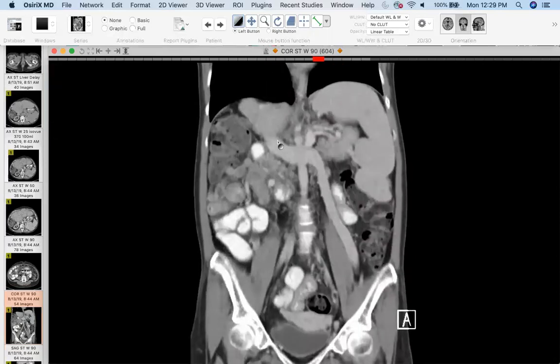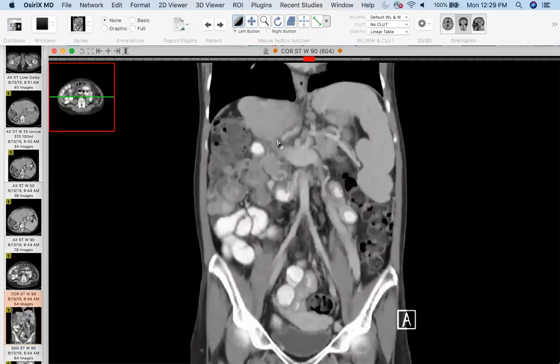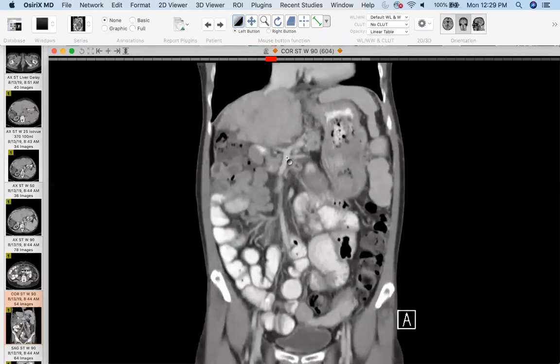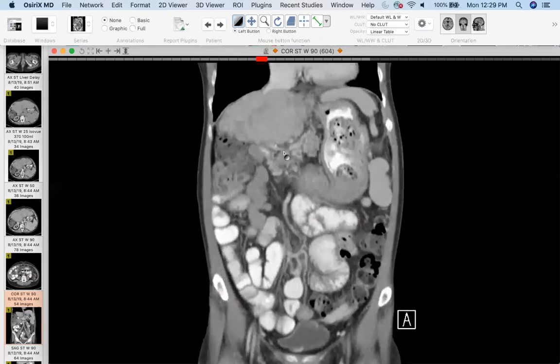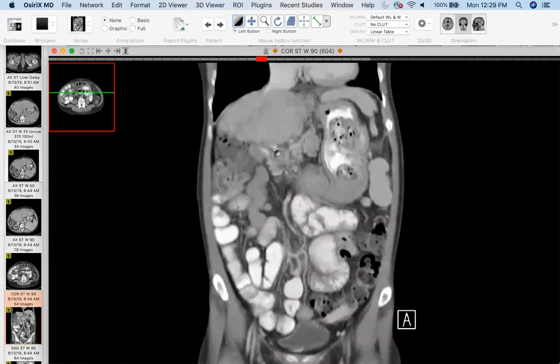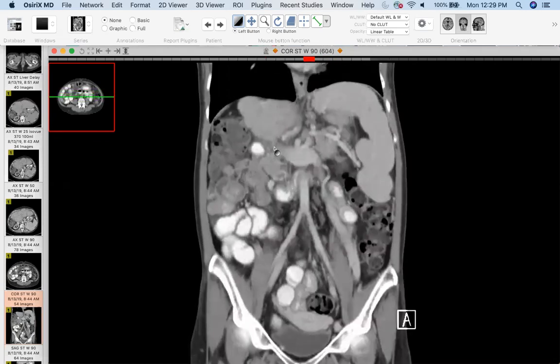Kate or Faisal, any thoughts? Feel free to chime in. So the main portal vein, it's here. So here's the SMV. And then that's probably going somewhere here. So this is just a left-sided IVC? Yeah, so what is it? That was my question when I saw this case.